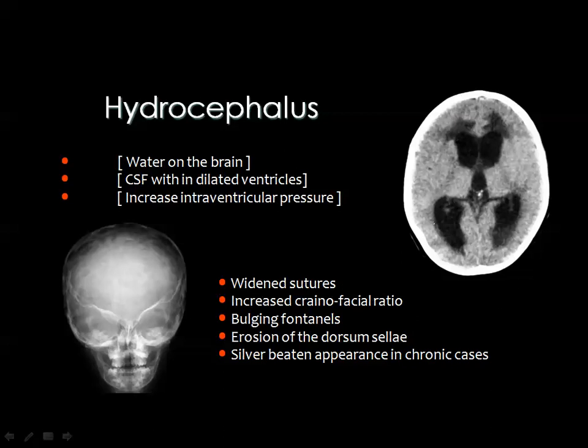And what we call periventricular edema means that the CSF accumulated in the ventricles, which fails to go through the normal pathways, has no alternative but to go retrograde through the ventricular wall, forming what is known as periventricular edema, which is patches of hypodensities around the ventricles due to what is known as retrograde transependymal CSF permeation.